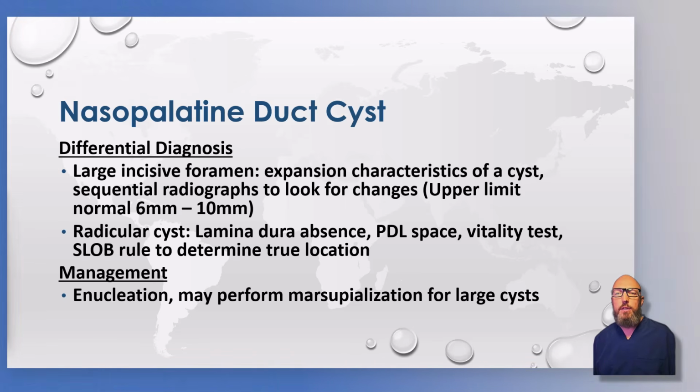Also consider radicular cyst, and we told you how to distinguish that by the absence of the lamina dura, the PDL space.